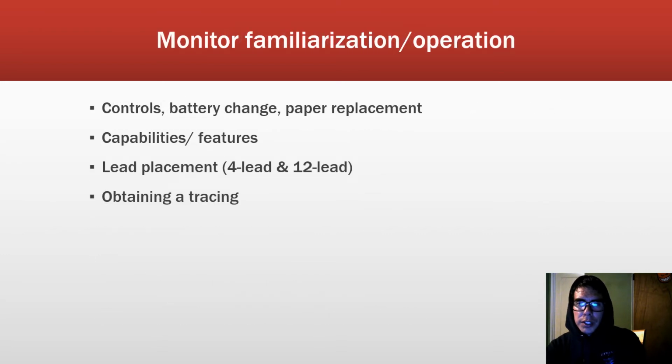So first we're going to talk about monitor familiarization and operation. So we're going to go a little bit over controls, battery change, paper replacement, capabilities and features, 4-lead and 12-lead placement, and obtaining a tracing.